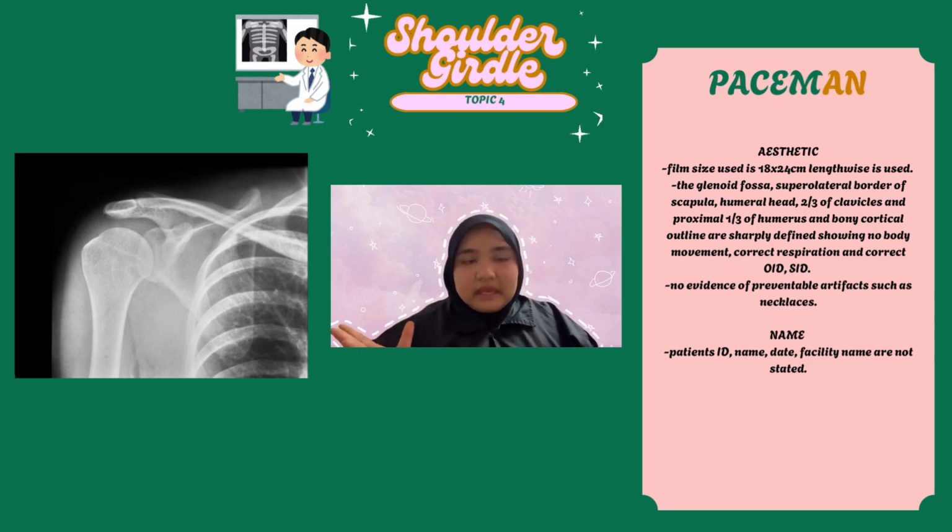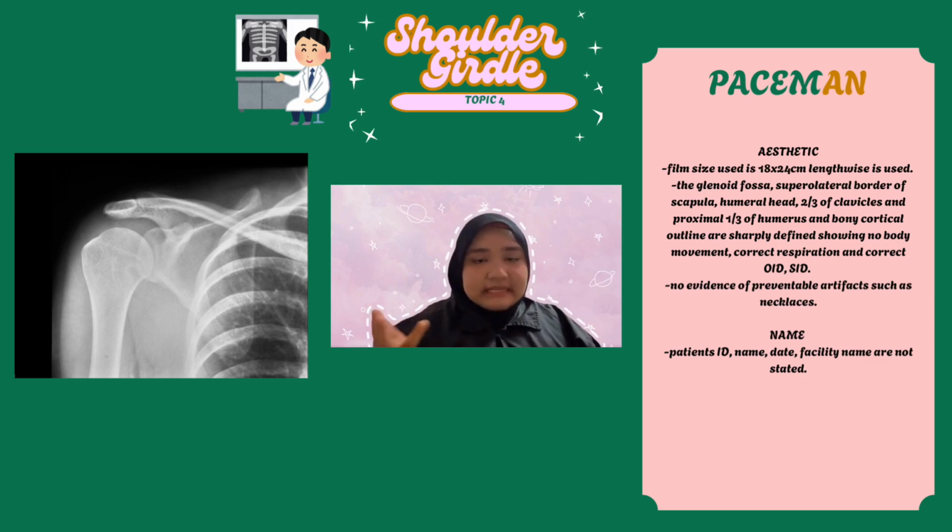Last one, we have name. Patient's ID, name, date, and facility name are not stated.